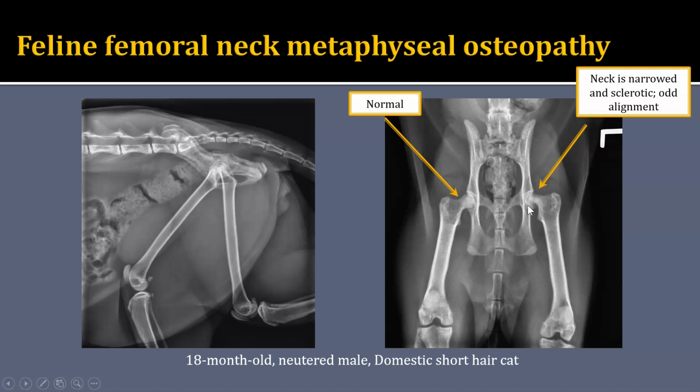When I look for where the femoral head is, it's still within the acetabulum here, but this part of the femoral head should be lining up with the femoral neck, like on the right-hand side.